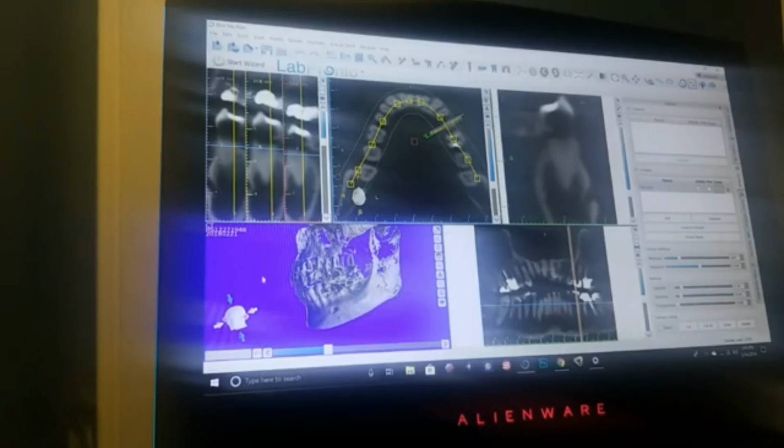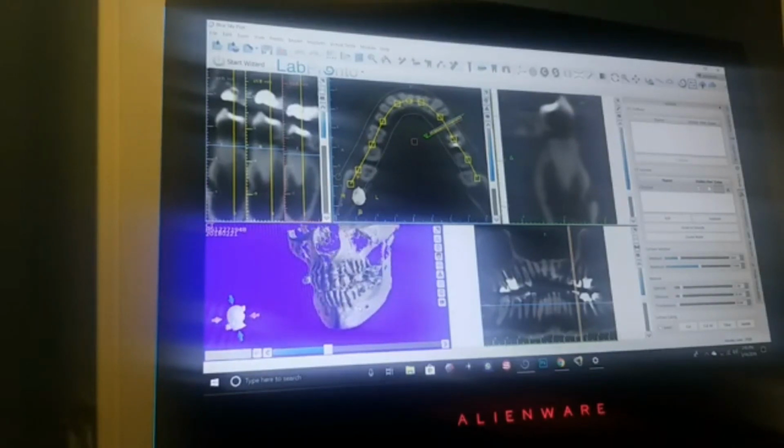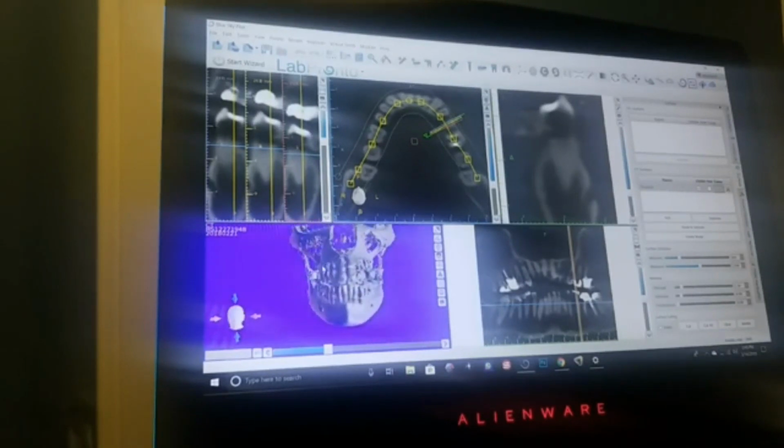Of course, we know the mandible and the maxilla don't match each other. So right now, my entire concentration, as you're looking in here, is on the mandible. Our blue line is in the mandible, where it shows in the axial. Our cross-sectional is in the mandible. You could see the teeth are down here, okay? I concentrated everything in the mandible. Although I have the maxillary image as well, I was looking into the mandible to work in the mandible.